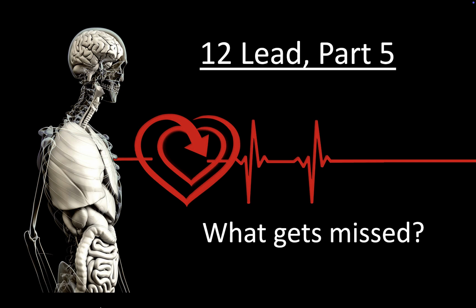Hello and welcome to 12 Lead Part 5, What Gets Missed. This is where I'm going to talk about some of the parts of the heart that we don't see clearly with our standard 12 lead, some clues as to when you might want to look a little further, and some ideas about other clues to a significant cardiac event that don't meet our typical STEMI criteria.